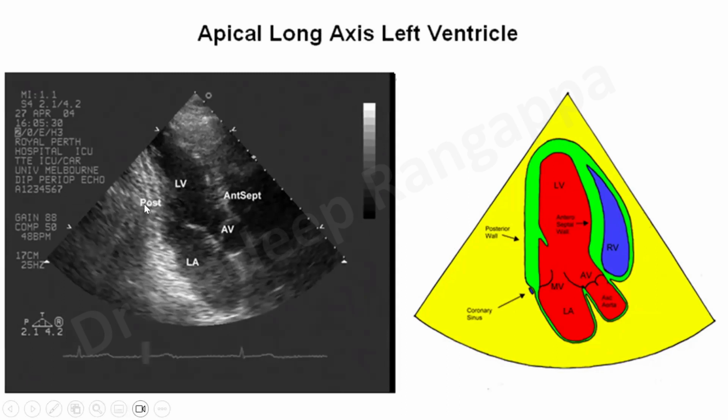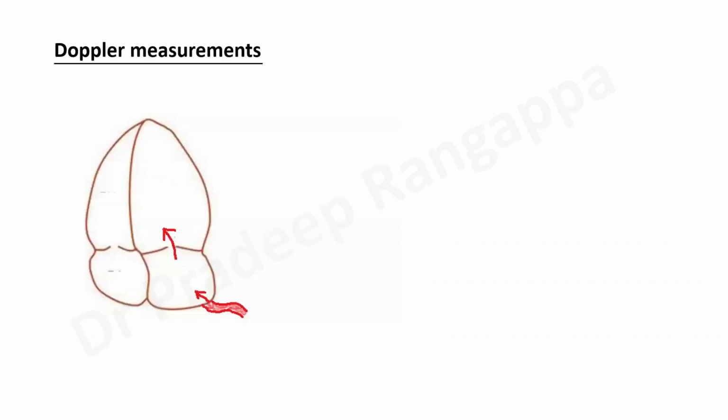So that is why you would have seen cardiologists reporting regional wall motion abnormality in the anterior wall or the inferior wall or the posterior. So you need two-chamber to look at the anterior and the inferior. You need three-chamber view to look at the anteroseptal and posterior wall. So obviously when you do an apical, make sure you look for 2-chamber, 3-chamber, 4-chamber, and 5-chamber view for your stroke volume and LVOT VTI.